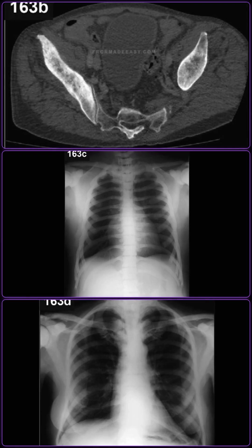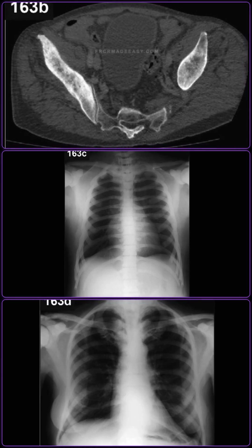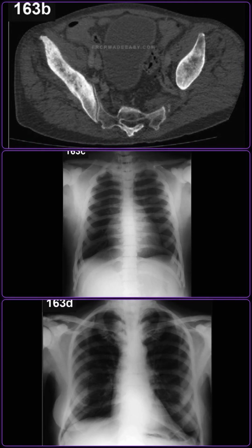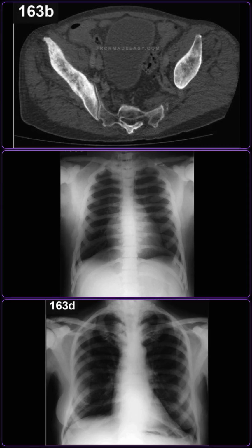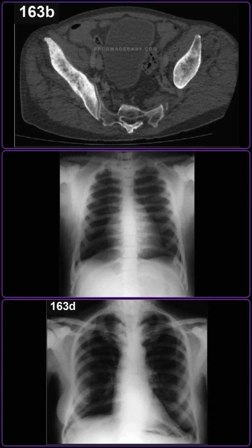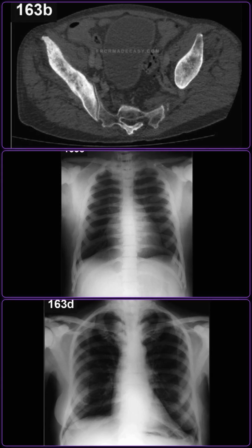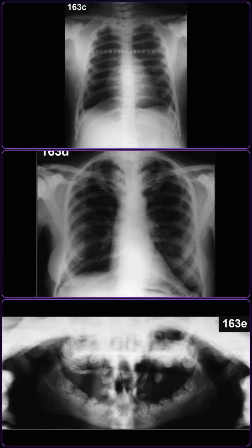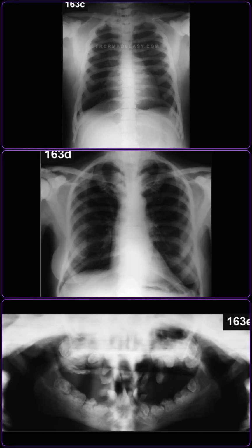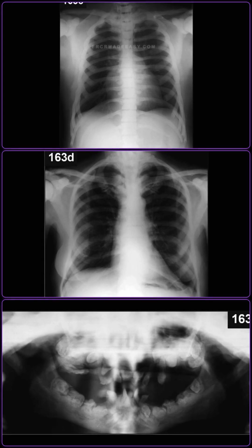The first comparison chest radiograph demonstrates diffuse uniform osteosclerosis in an adult with osteopetrosis, where the intervertebral discs remain clearly visible, confirming true osteosclerosis rather than an underpenetrated film. The second chest radiograph shows diffuse osteosclerotic metastases from prostate cancer in a male patient, along with gynaecomastia secondary to hormone therapy. The last dental radiograph demonstrates dense osteosclerosis of the mandible and multiple supernumerary teeth, which is a classic associated finding in osteopetrosis.